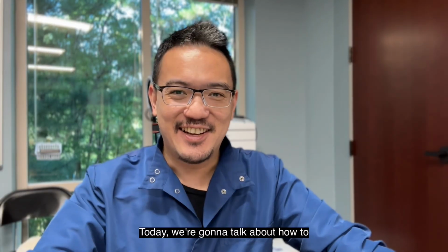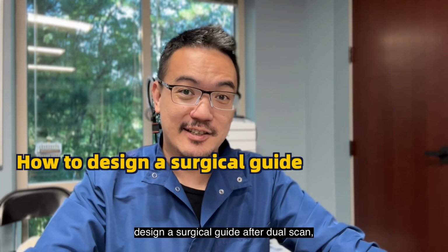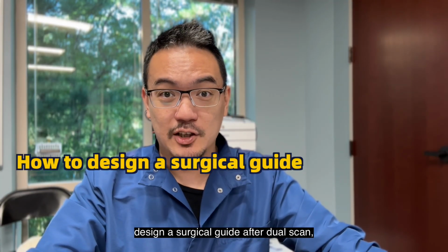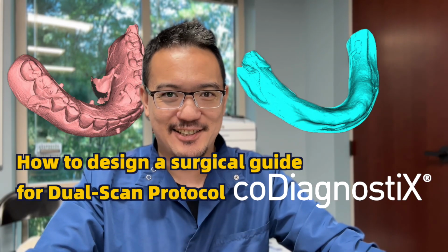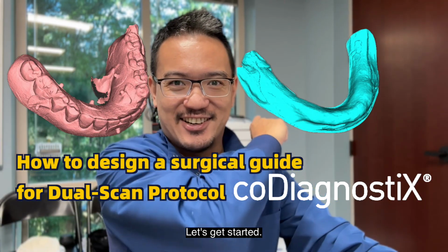Hello! Today we're gonna talk about how to design a surgical guide after dual scan CT protocol in CoDiagnostiX. Let's get started!